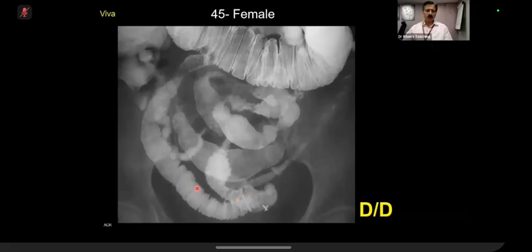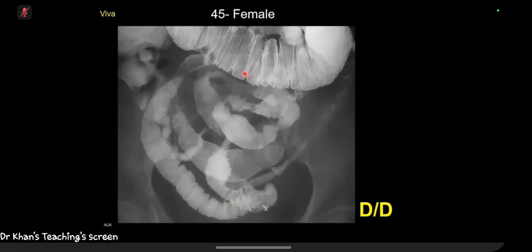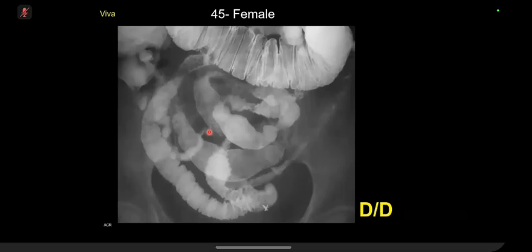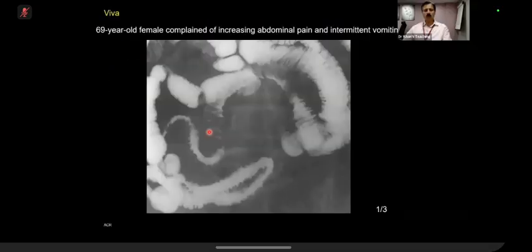Right. And what do you think about this loop here? Is there a bit of mucosal thickening? Yes, there is mucosal thickening there. Right. And what is happening here? Is there a bit of obstruction? Yeah, proximally the loops are dilated. Okay, so now this is a classical example where you can see chronic changes and a bit of acute changes, and this all fits in radiation. So please remember that radiation changes just go on and on. Both things can go together. Okay.